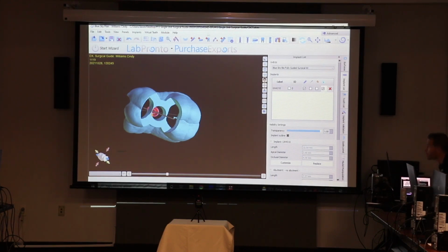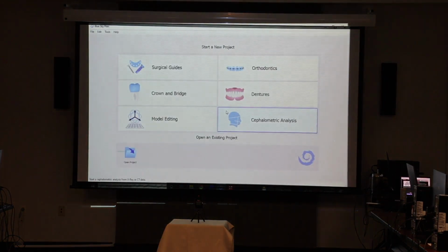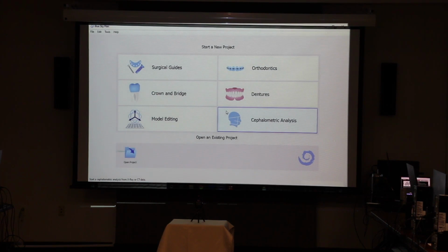So what everybody wants to do now, everybody should just go up and hit the big X in the folder. This is going to close our project. You can discard the save. Let's all get back to the start project window, and let's go through this one more time. So it's all about the repetition.